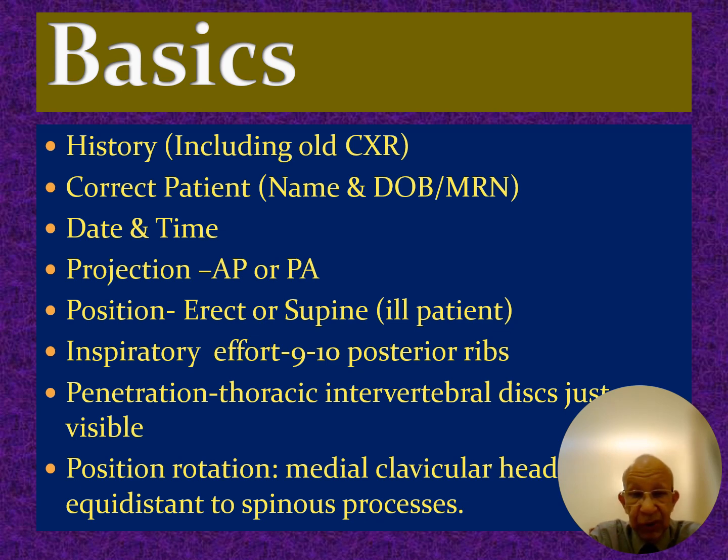The projection: is it an AP or PA film? An anterior posterior film makes it difficult to interpret the cardiothoracic ratio. And look at the position, erect or supine.